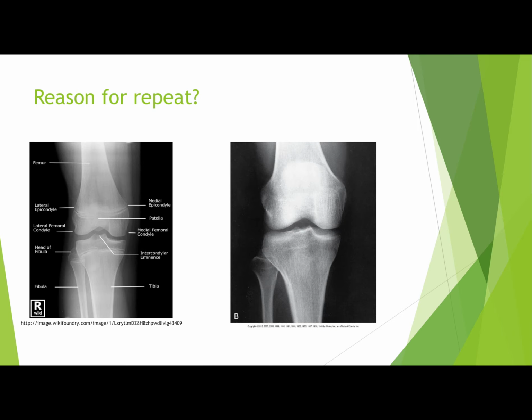The central ray was angled appropriately for the radiograph on the left, which opened up the knee joint space. It really all depends on the patient's body habitus and the thickness between the top of the ASIS to the tabletop. The central ray needs to be angled more cephalic for the radiograph on the right to open up the knee joint space a little bit more.